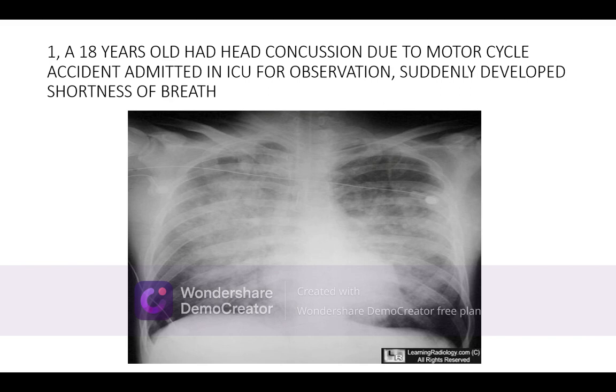It is possible, yes. Chronic inflammation of the lung is less likely, because the time lapse is very short. Tuberculosis can be present in this fashion, yes, it may present like this. It will be a diagnosis of exclusion for anything visible in the X-ray.